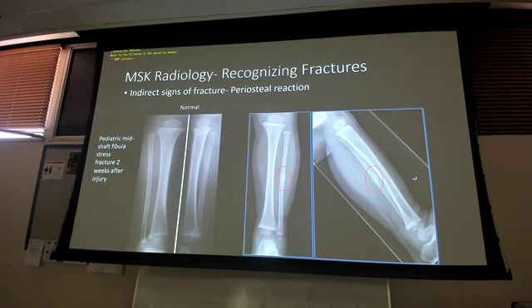There and there, right? So this is when that kid comes in, maybe they're playing on the playground and they've been complaining their leg hurts. They've been complaining their leg hurts for 2 weeks. Mom and dad are finally like, my God, you won't shut up about it. Fine, we'll go to the dang doctor. Go to the doctor, they get the x-ray, you see the periosteal reaction.